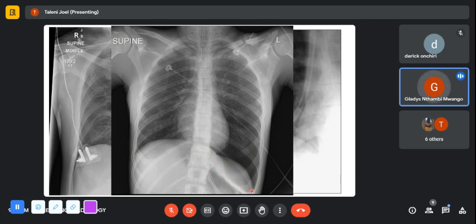Can you outline them, Taleni? This one? No, not the rib. I thought it goes and plunges down suddenly. So go up. Start from medially, Taleni. Medially. Then from there, you're going fast. So just go back, Taleni.